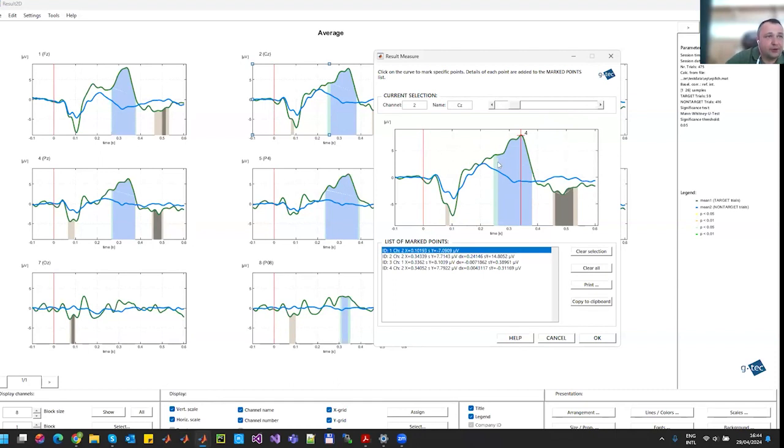Again, we can see in here that the small patch is green and this part is blue. The green means that it's statistically significant, so the p-value is below 0.05. For the blue ones, it's highly statistically significant, and the p-value is below 0.01. The gray part in here is similar, only that it's negative, so the difference between targets and non-targets is negative. The p-value for the light green part is below 0.05, and for the gray one, below 0.01.